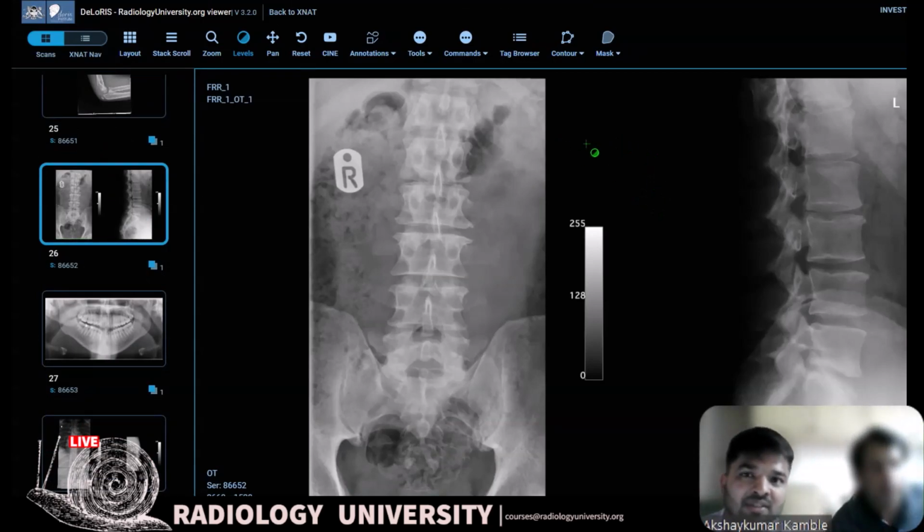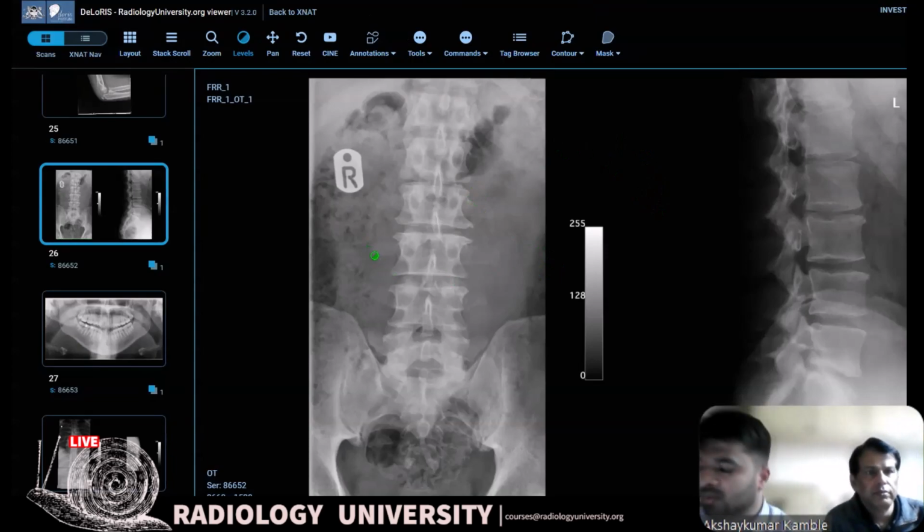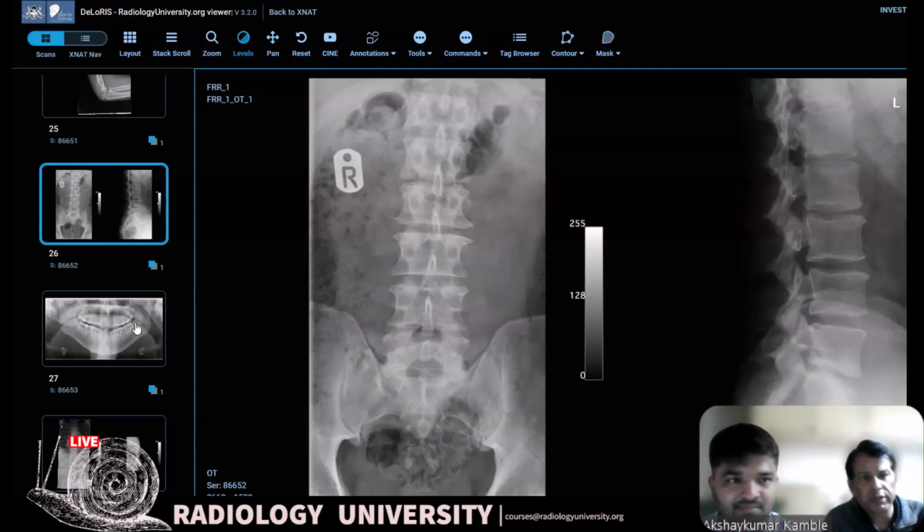Does anyone have any questions about why this is not normal? This is normal. The joint is normal and the spine is normal. Minor osteophytes are normal. Look for pars defects for rapid reporting. That's the main of your review, and the SI joint.